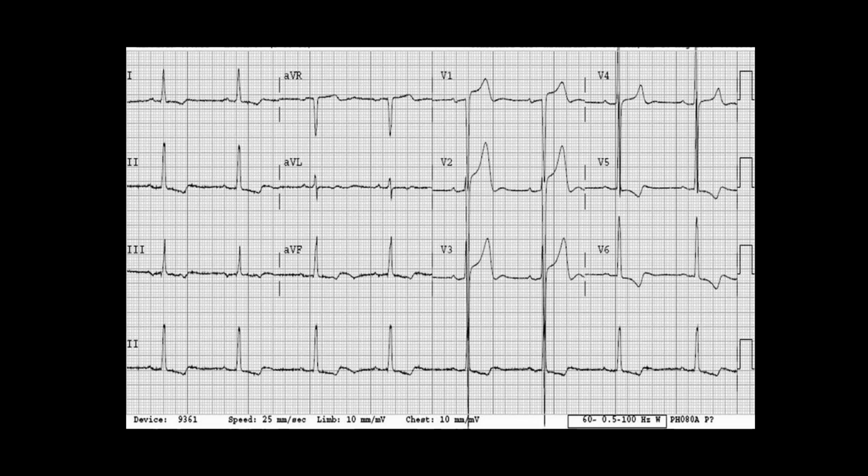So yes, the T wave can and should pull the ST segment when you have an abnormal depolarization such as this, but there is a limit to it. And so again, the bigger the QRS complex, the more that limit would be. And we're not even close to that 25% mark with that amount of ST elevation. It's hard to even measure how big those QRS complexes are because they bleed into the subsequent leads below or above them. So again, that's a clear hallmark of an enlarged left ventricle or some sort of hypertrophy.